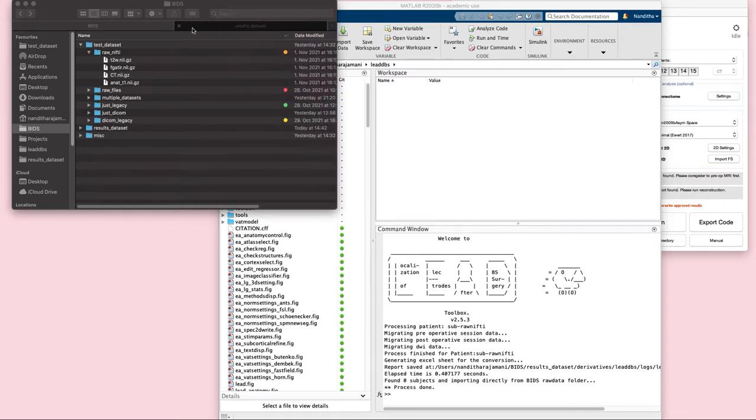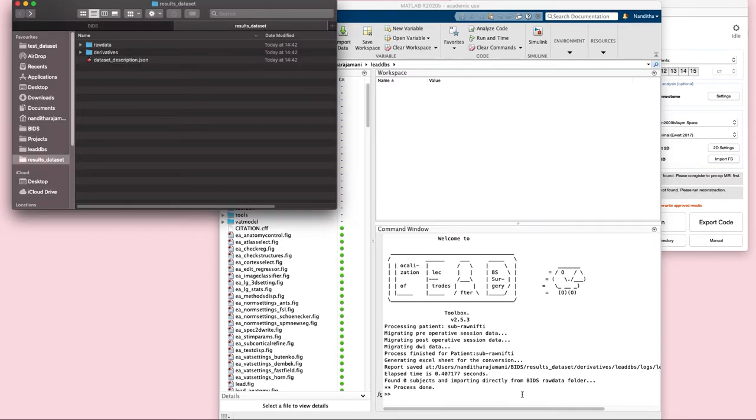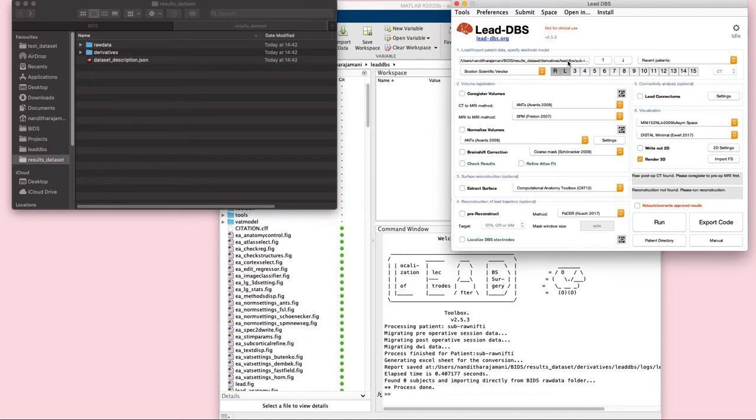Great. So after it's run, Lead-DBS directly loads the patient into it, and you can see that it says raw post-op CT is found. Please co-register to pre-op MRI first. So that's good news. Lead-DBS has already converted our old data set into a BIDS compliant version and loaded it for further processing.